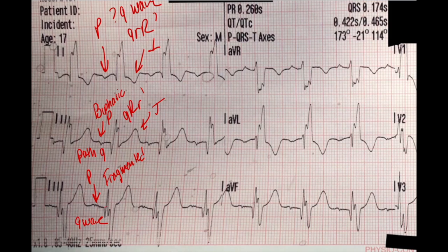Another thing that's interesting is we seem to have some ST elevation of about 1 millimeter. But keep in mind, I should have mentioned this earlier, this was one of my patients. He's 17, African American, and male. So benign early repol is very likely for this elevation and this somewhat hyperacute T wave. But even if we look at the criteria, how big should the T waves be in the limb leads?